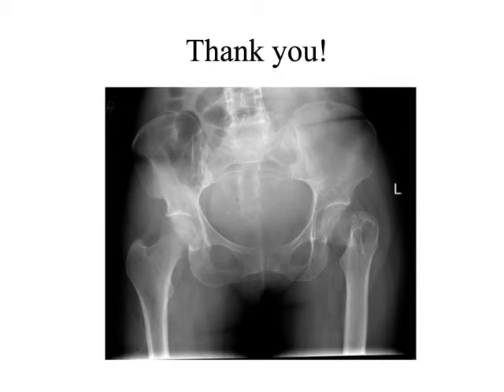Slightly rotated. Which way are they rotated, Katie? They're rotated to their right. You're right, because this obturator foramen is open more than the left. That's really good. What else is going on? So we've established that it's a little bit burned out. The patient's a little rotated. They didn't collimate really well.